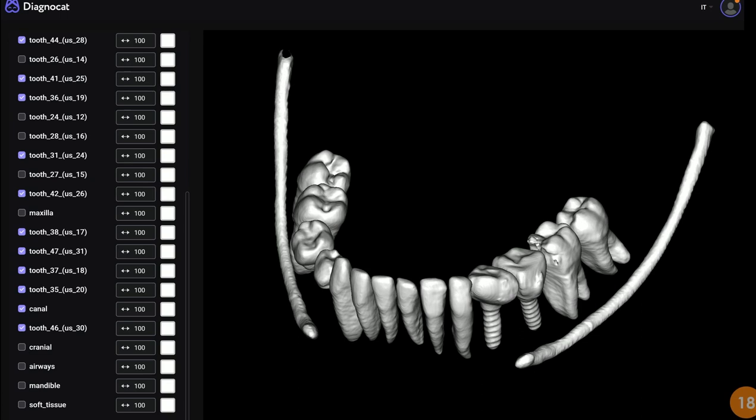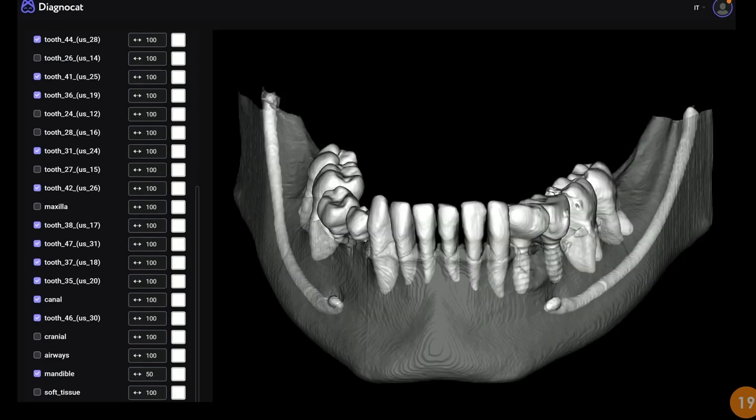And one of the new additions of the software will be the possibility to upload an intraoral scan and then to match the intraoral scan with the existing 3D reconstruction of the bone. So everything comes from the radiology. This is the whole appearance of the bone reconstruction, 3D model of the bone, the nerves, the relation of the nerves with the teeth and the teeth themselves. It's very useful for the diagnosis. It's very useful also for the treatment plan.